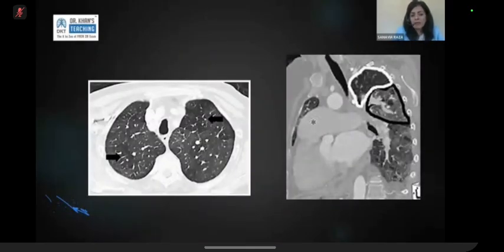Again, this is just to drive down the point. The mosaic attenuation, you can choose a term to describe an abnormality. In this one, for example, the sagittal view, the top is normal. This one has a bit of ground glass. On visual inspection, you can say that, oh, is this mosaic attenuation? Well, it is, but does it really imply a diagnosis? Is it helpful in any way? Not really. So would you be right in describing that lung, that axial section, as mosaic attenuation? Yes, you would be.